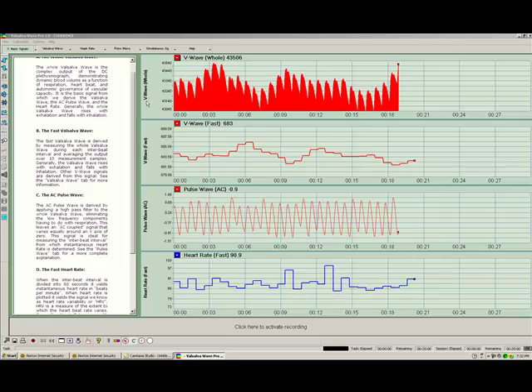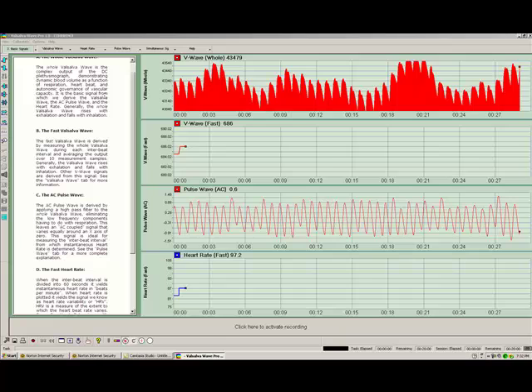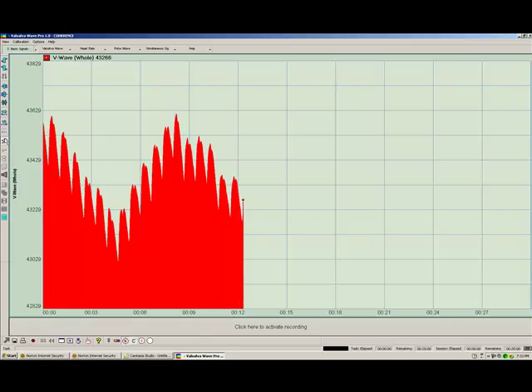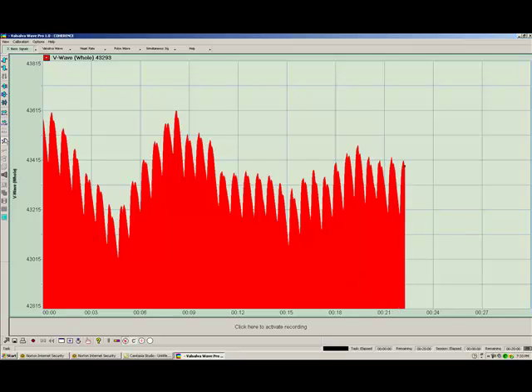Now, before we leave this panel, I want to demonstrate one of the controls on the left-hand side, or actually all of them now. We'll use this opportunity. That is the magnifying glass. So if I want to select whole valsalva wave and then shift to full screen view, I click on the magnifying glass, and now I have a full screen view of the whole valsalva wave, which I can use for monitoring purposes or certainly for biofeedback purposes.